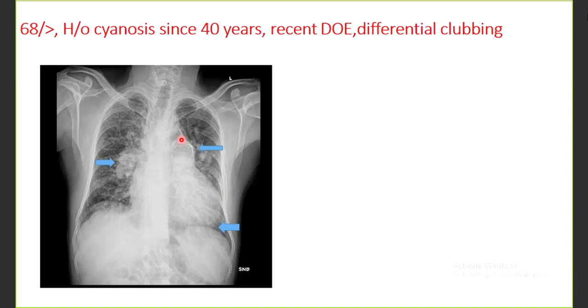But it is uncommon to see calcification in the pulmonary artery because the pulmonary arteries are not exposed to very high pressures. So whenever you note calcification in the pulmonary artery, always consider an Eisenmenger patient, or a patient with severe pulmonary artery hypertension, or a patient with some metabolic disease because of excessive deposition of calcium in various parts of the vasculature. This patient also has a prominent right descending pulmonary artery, and then there is increased ground-glass appearance suggestive of heart failure along with other minor prominence.